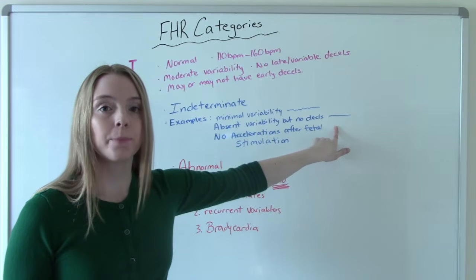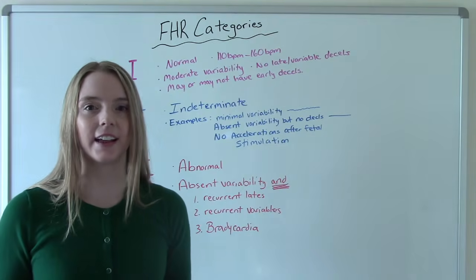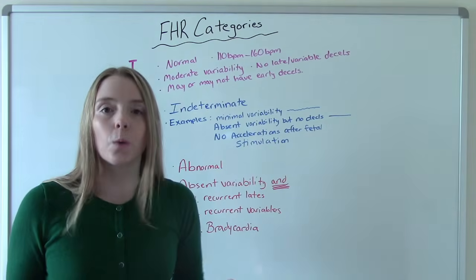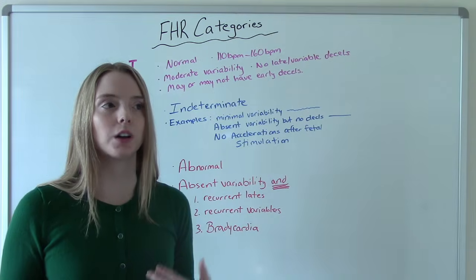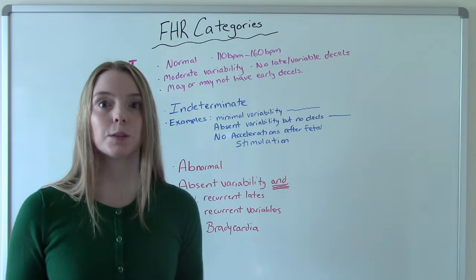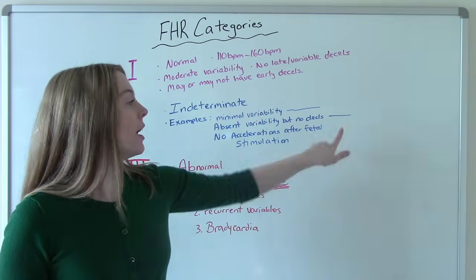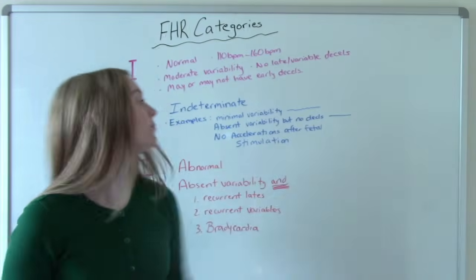We expect that. So if you just did an intervention like that and then you see baby goes down like this and gets a little flat, you don't really need to freak out too much because you know, oh yes, that's why that's happening. You can explain why it happened. If it lasts for too long, then we're worried about it, but at least you know why it happened.